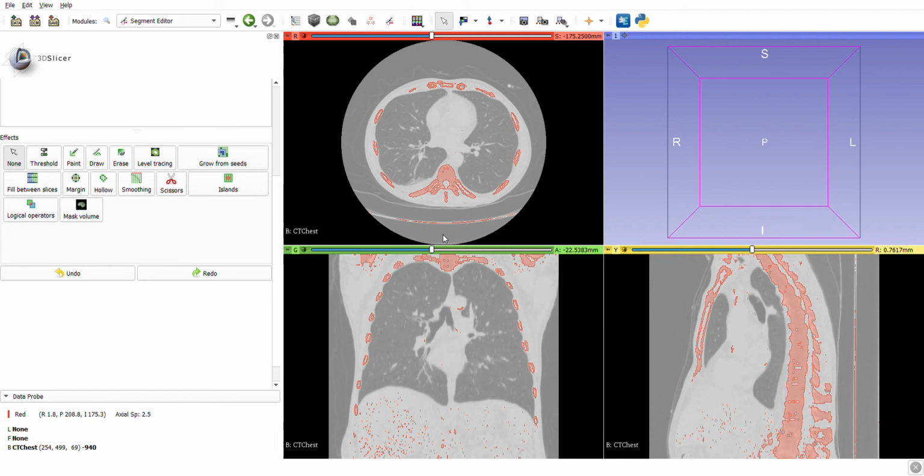As soon as you click on apply, this becomes stable and constant, it's not blinking. So now we have made the image more clear. Earlier the image was more of a general image, and now we have focused upon a particular part. Now we will remove the unwanted part. Now how will we understand which part is unwanted?